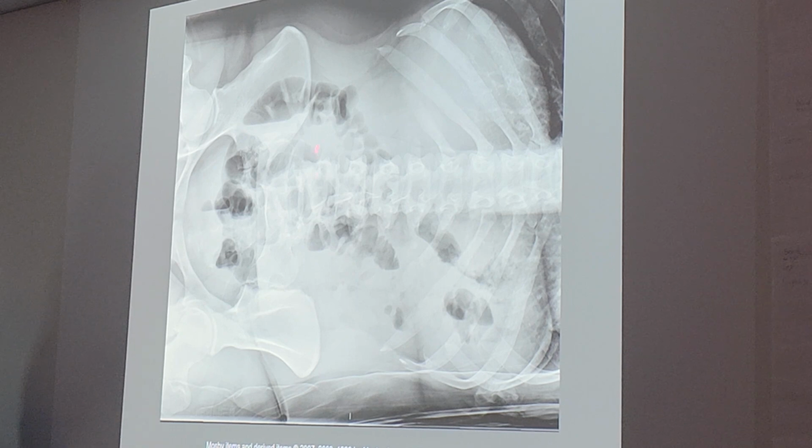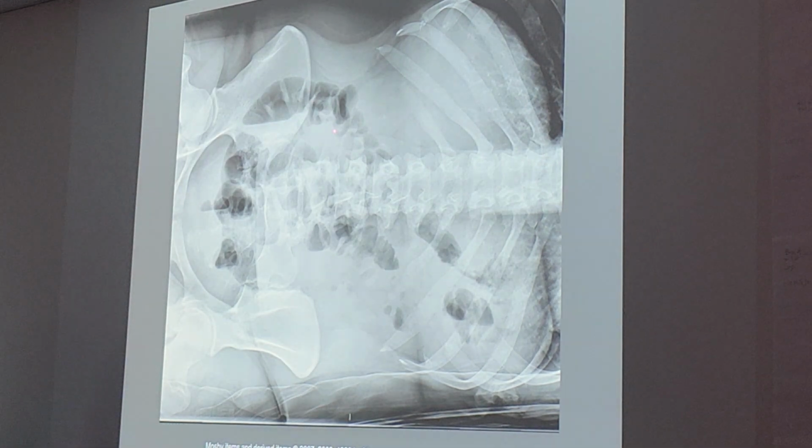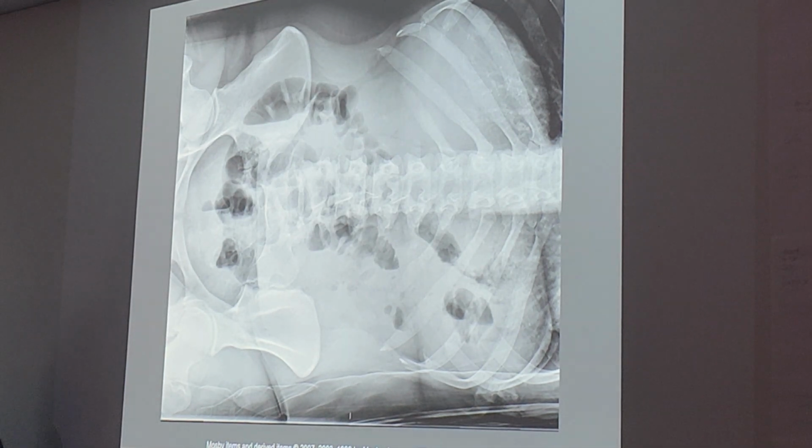Where do you see that? Do you see the ribs? Remember that peritoneal fat layer that I told y'all about? Can't really see it, but actually you can see the psoas muscles. See this shadow right here? Yes, ma'am. Alright, good. But why can you only see it on one side every time?